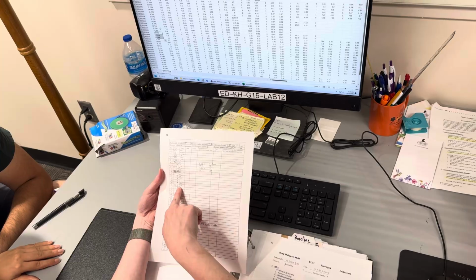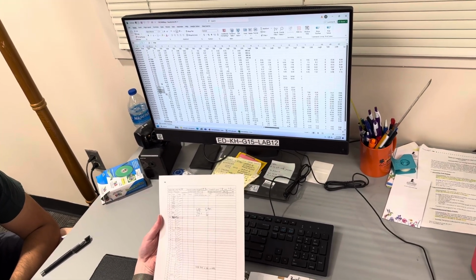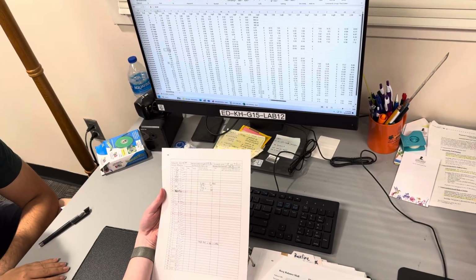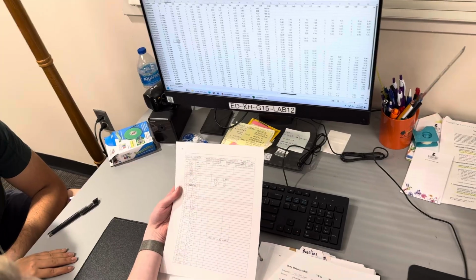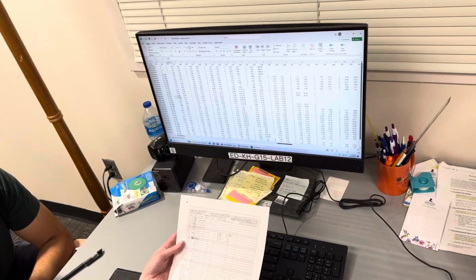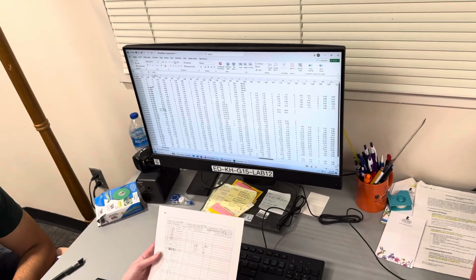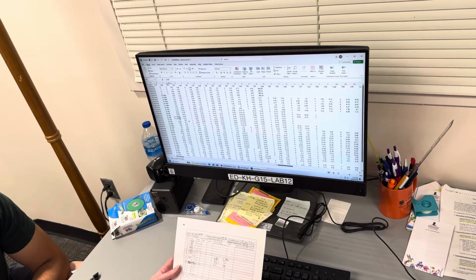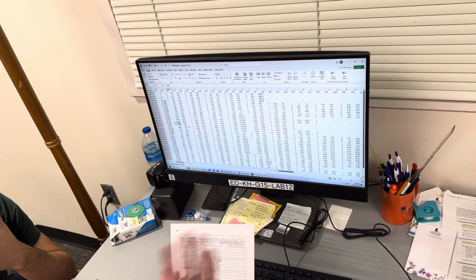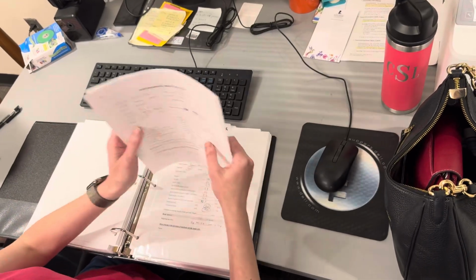Now these codes here are different. Sometimes they might not match up. A lot of times when we're writing in, this is gait slip, gait trip, gait non-slip. Once you know that, you'll know what is what, and you can ask anyone if they don't know. So pretty much trial number, and then the code for the type. And for stat, as you can see, there are lots of trials to do. It's probably the longest one. Okay, so that's how to set up the file.